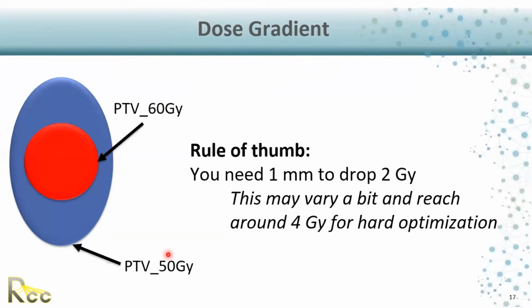It's very important for you that you have dose coverage properly, and also those gradient drop-offs from a certain amount of dose to another amount of dose. This is very crucial, especially when you are in the head and neck, you are talking about very challenging organs at risk like spinal cord, optic chiasm, optic nerve, brainstem, and all of these. They are very critical organs and you must take care of them. And the 1 or 2 millimeters really makes a big difference.